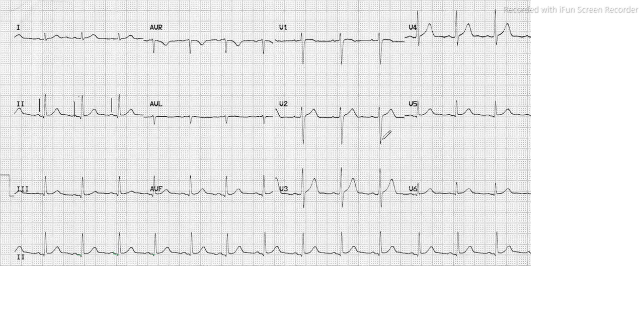Now the other thing to look at is the heart rate. First of all, you need to determine whether the given rhythm is regular or not. You see here it is occupying 1, 2, 3, 3.5 boxes; again 1, 2, 3, 3.5; 1, 2, 3, 3.5. So somehow it is regular.